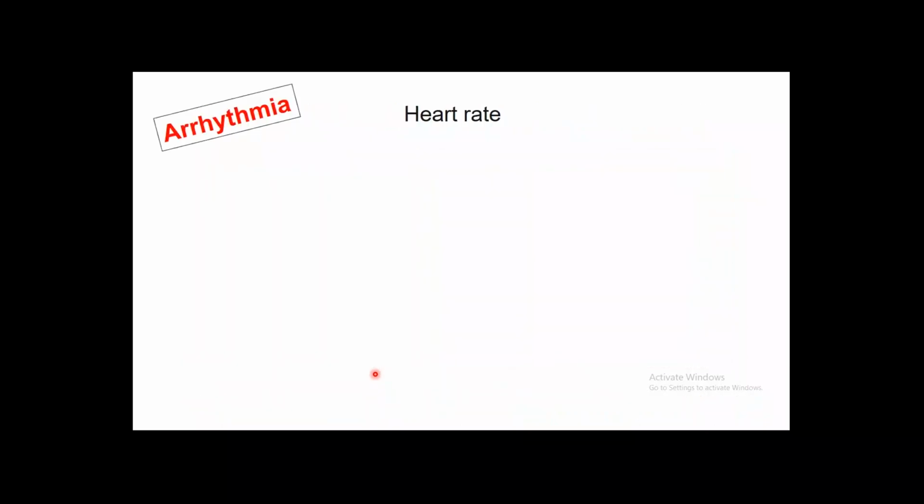Then we move to the second scenario, which is the arrhythmia scenario. A patient presenting with palpitation. How to approach arrhythmia rapidly? Starting with slow heart rate, looking then at the P wave QRS relationship. If we have progressive prolongation of the PR interval followed by a dropped QRS beat, this is called second degree Mobitz type 1 heart block.